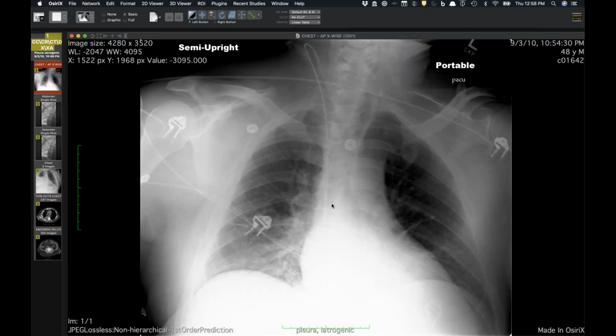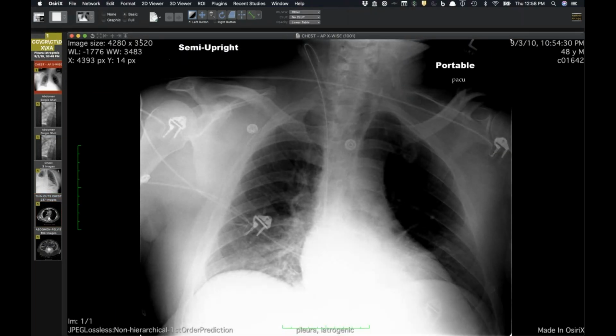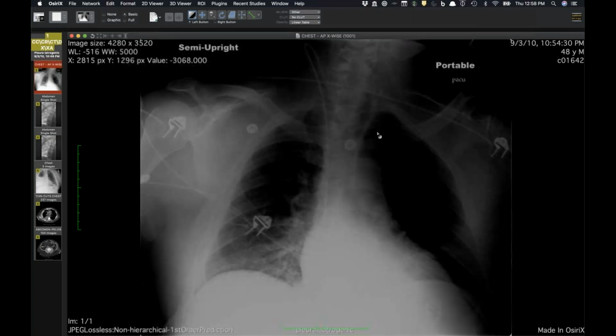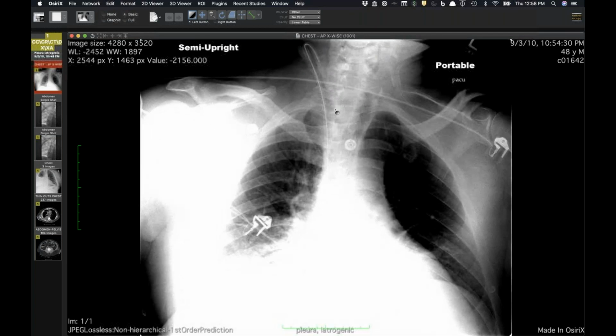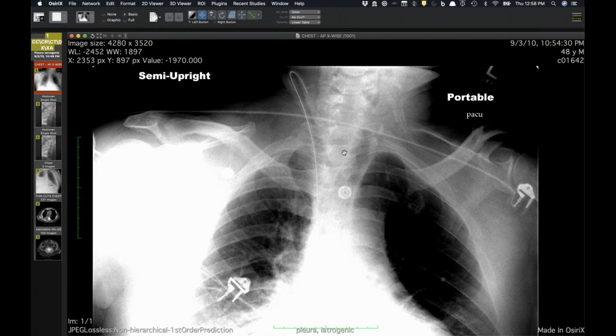And long story short, the last time the patient remembers, or the last time they could find out, that he had a line or a wire was 9 years ago. This was a radiograph from when he had a line placed, and you can see there's a wire in the line. I think the hub of the catheter is probably here.